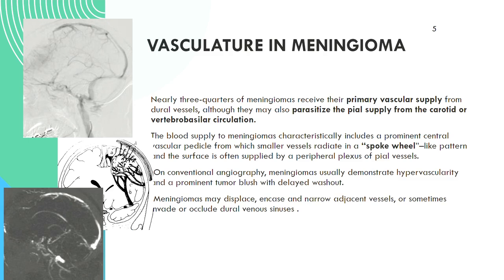MRI and CT play an important role in the demarcation of meningiomas for radiation planning. While tumor bulk and dural involvement are well appreciated on contrast enhanced MRI, fat-sat sequences are particularly useful for delineation of meningioma boundaries at the skull base and abutting venous sinuses. Tractography and high-resolution CSF sensitive sequences such as CISS can also be critical in helping identify cranial nerves during planning.